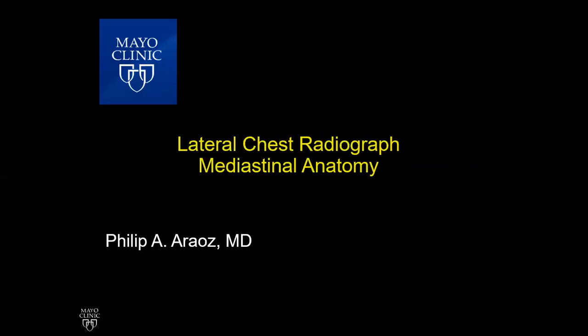I'm a radiologist at the Mayo Clinic, and I'm going to talk to you about lateral chest radiograph mediastinal anatomy. Here's a lateral radiograph. And I'm going to overlay a little bit of some lines to show you where the structures are and to show what structures we're going to go over.